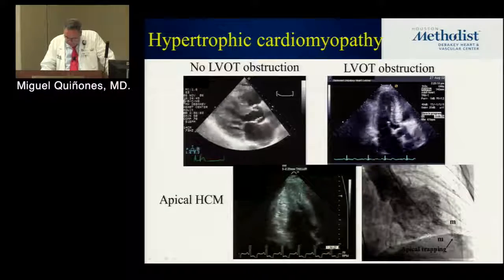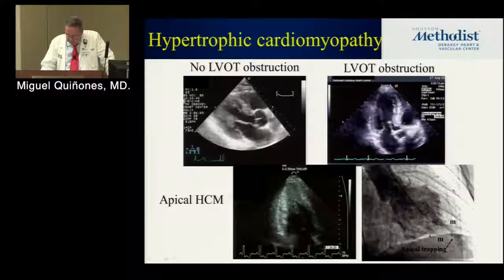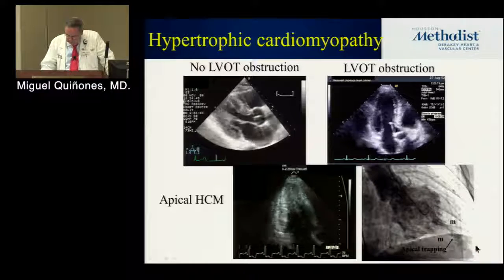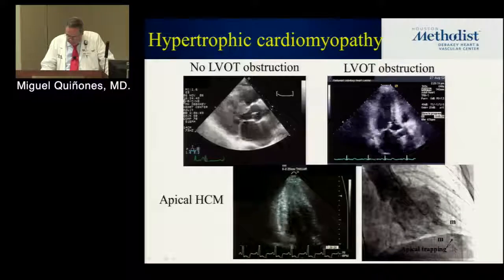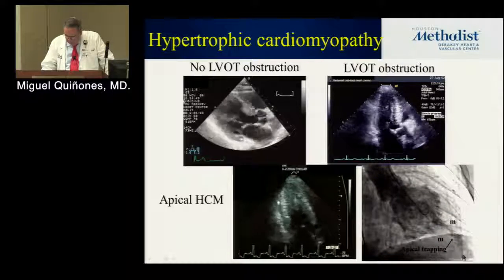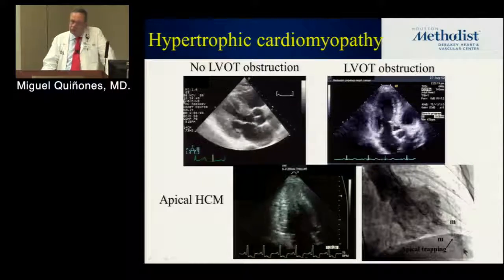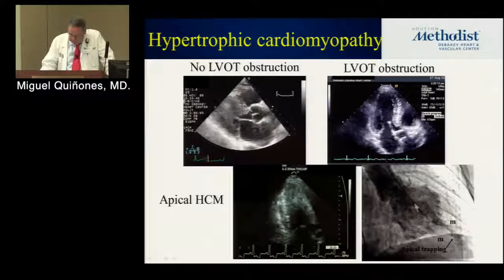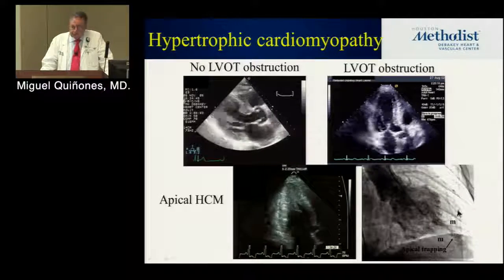myocardial hypertrophy, and the LV angiogram has this very classic look, like a spade in a playing card, where you have this apical trapping with a thin area of dye in it, very high pressure. If you put a catheter here, you might get pressures of 300 or 400 compared to here. And that's why, with exertion, they can get apical infarcts.